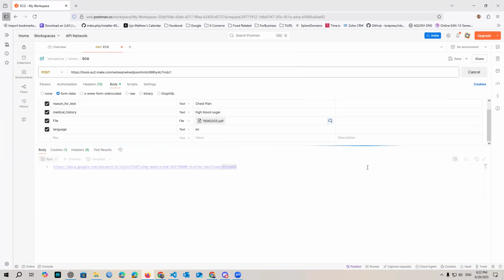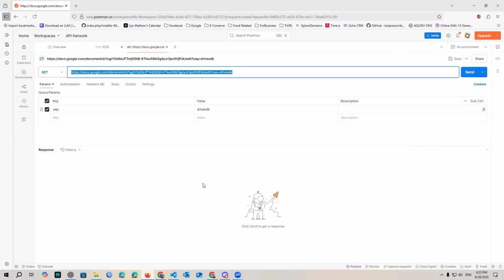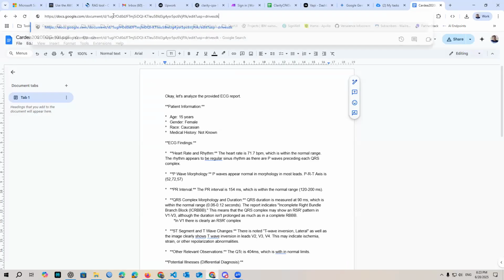Now let's see what it does. This is a bigger file. It took some time, but as you can see, we have the output.